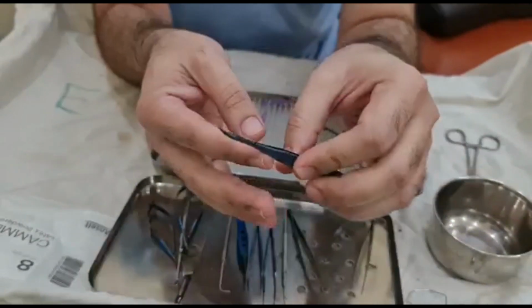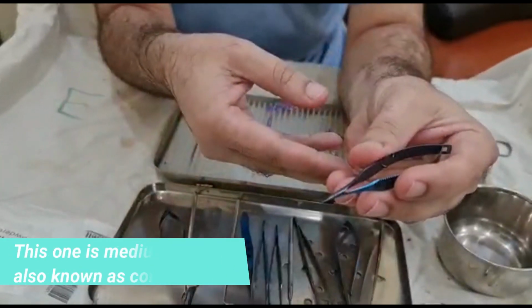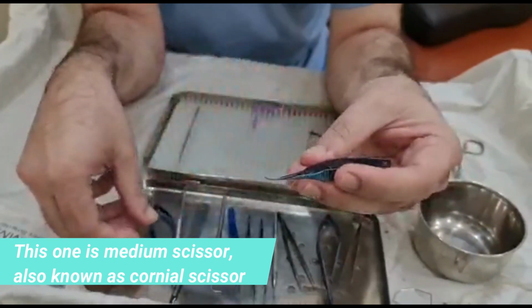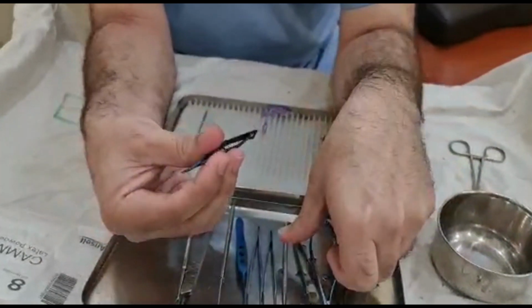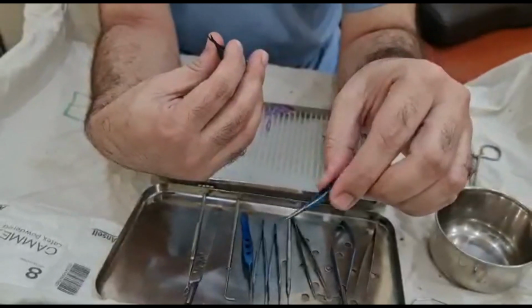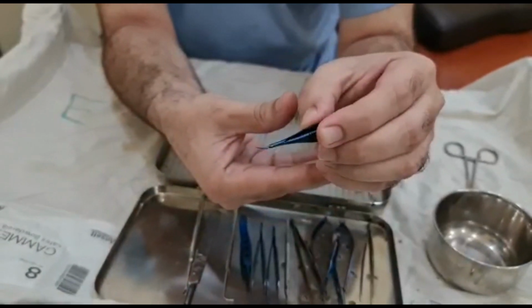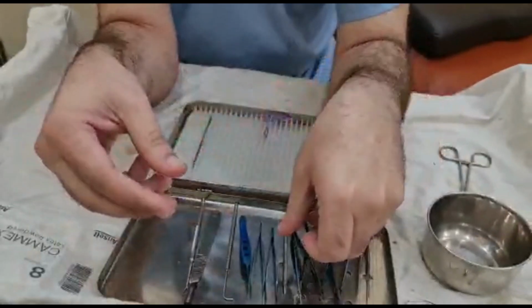The medium one is the corneal scissor, which we use to cut the cornea, and with it we can also cut stitches or sutures. The smaller one we use for iris cutting, peripheral iridectomy when you do trabeculectomy.